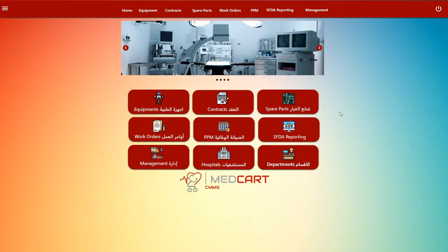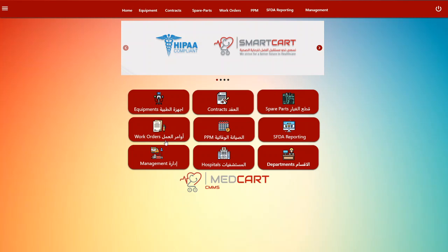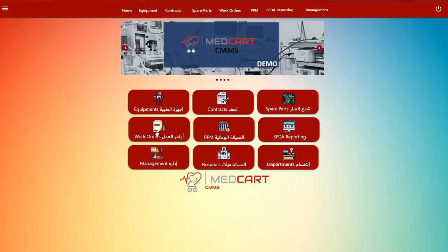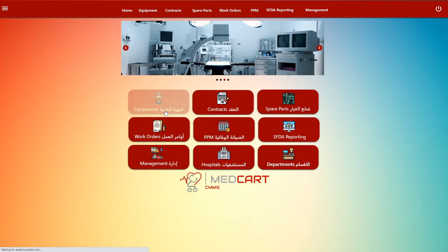So we are finished with equipments, contracts, and spare parts. This is our last tutorial, and our next tutorial is making work orders. As you remember, if we go to equipments, we also have a work order.